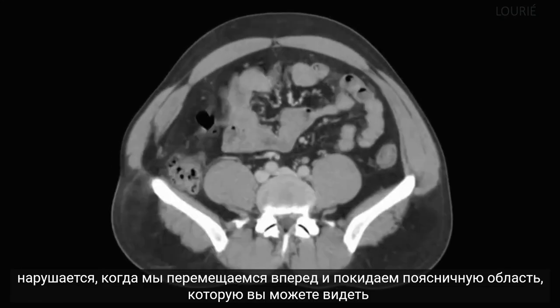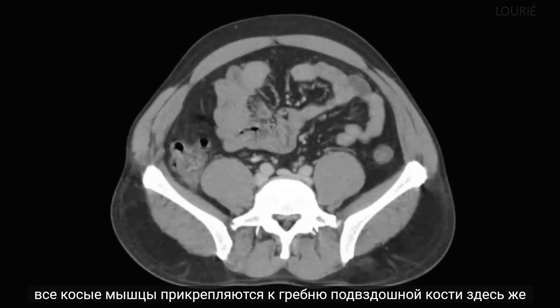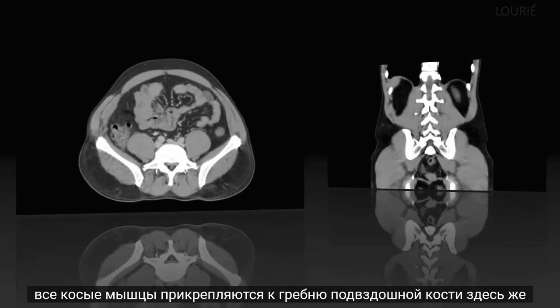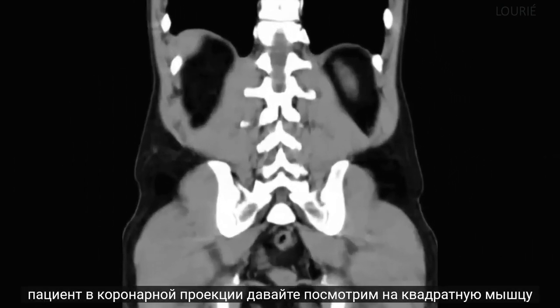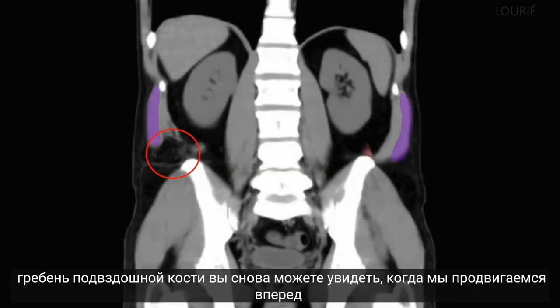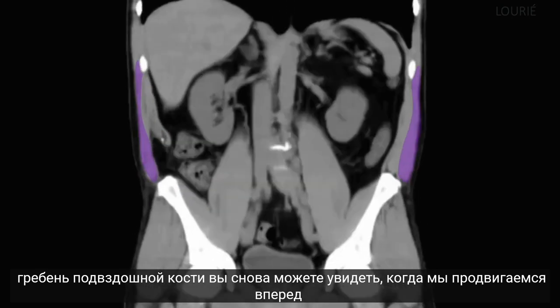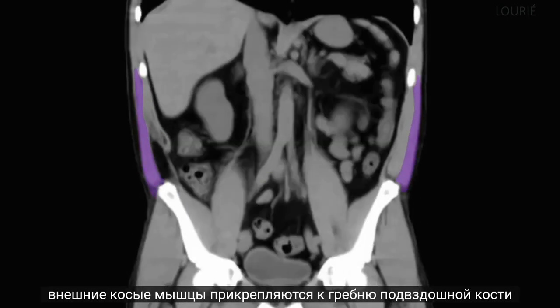As we move more anteriorly and leave the lumbar area, you can see all of the obliques are attached to the iliac crest. Here in the same patient in a coronal view, let's take a look at the quadratus lumborum. You can see Petit's hernia here above the iliac crest. You can see again as we move anteriorly, the external obliques are attached to the iliac crest.